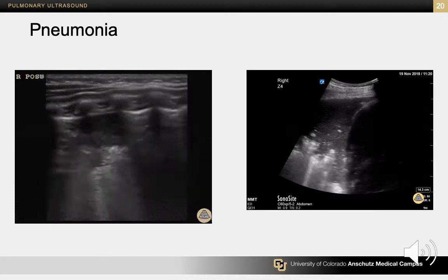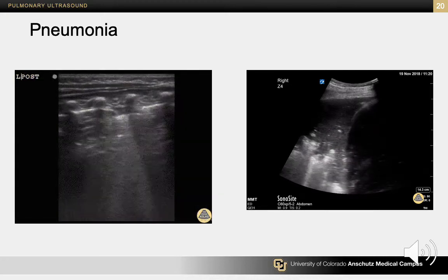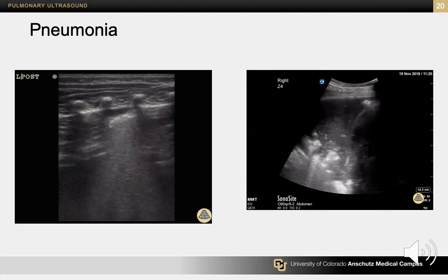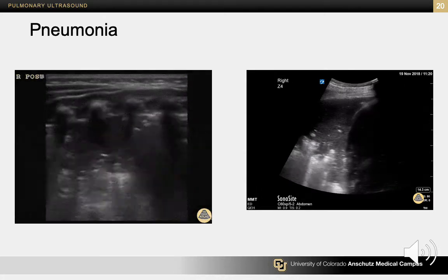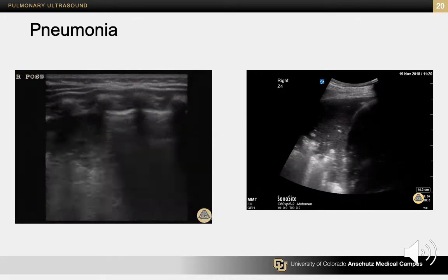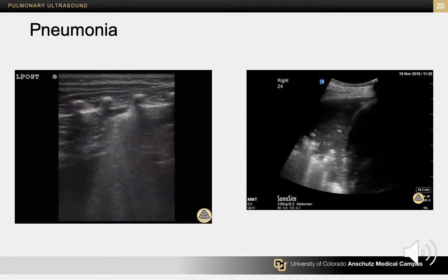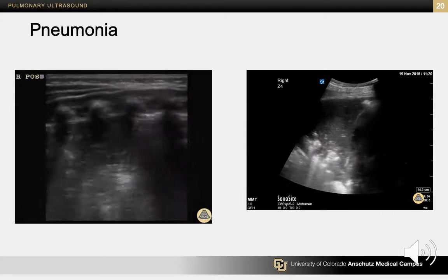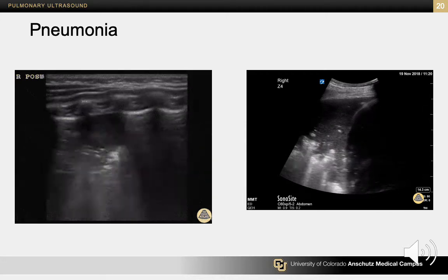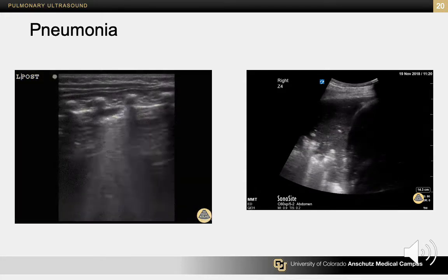Okay, so this left-hand image is an infant patient. You can see these small rib shadows here. Again, visceral parietal pleural interface here, skin up here. The pleura comes along nicely, and then you have this divot with some B lines. Same thing here: a divot, some B lines, as we would expect with fluid in the lung.